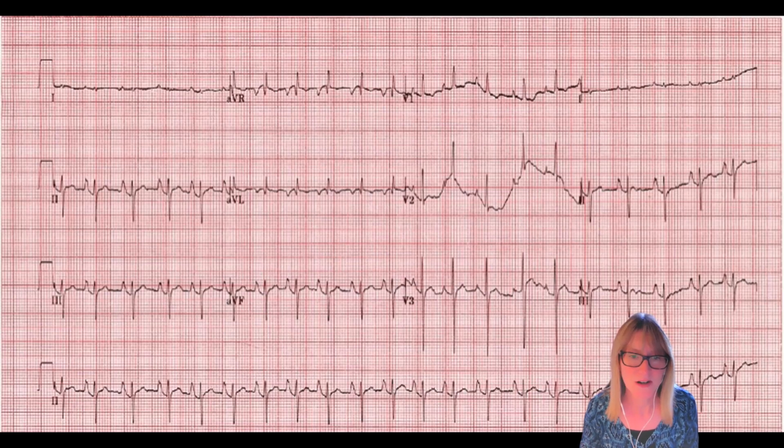I think the interesting part of this is in fact related to the QRS morphology and the mean electrical axis. So let's chat about that. Recalling, how do we do that mean electrical axis activity again? Number 1, we look in the frontal plane leads: 1, 2, 3, aVR, aVL, aVF.